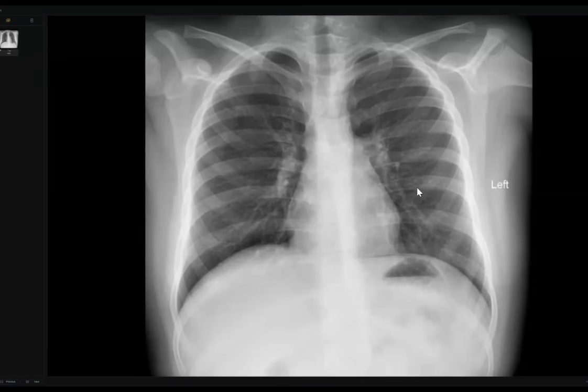Number one, sometimes you find the pneumoperitoneum, especially if very subtle, and you can't pick up the site of perforation. So it will be very helpful. Number two, it will ensure this is a true perforated viscus. But we should not give barium. It will cause chemical peritonitis.